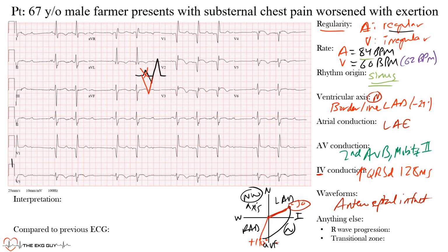So whether it's an old or a new infarct, you can see this. Notice you have a QR wave. This late R wave, that late vector that's coming towards the right ventricle, that slurred S wave that we see here, the prolongation of the QRS complex, this is a complete right bundle branch block pattern. So complete right bundle branch block is present here as well.